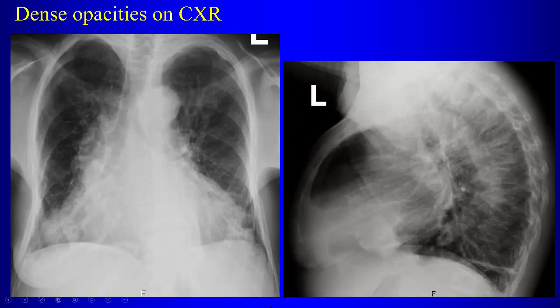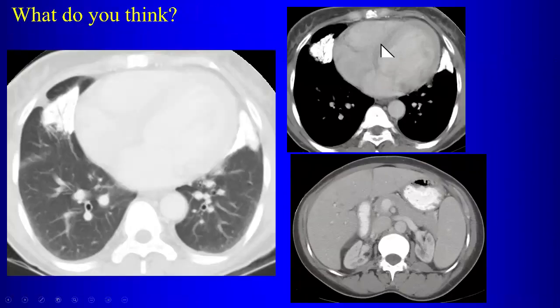This radiograph shows, well, I kind of told you, right? You see the opacities. Where are the opacities? Can you do better than that? Come on, I mean, we're in the lungs. Right, lung base. Right middle lobe and, yeah, well, left lower lobe, right lower lobe. You see anything back here? No, I see them over here, right? So where are they going to be? Right middle lobe and lingular, right?